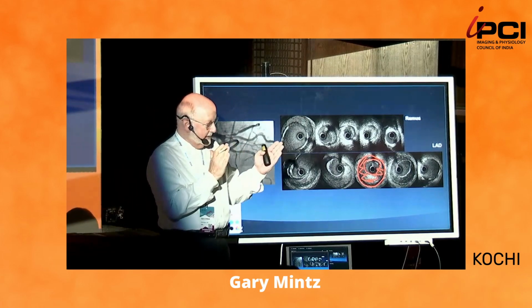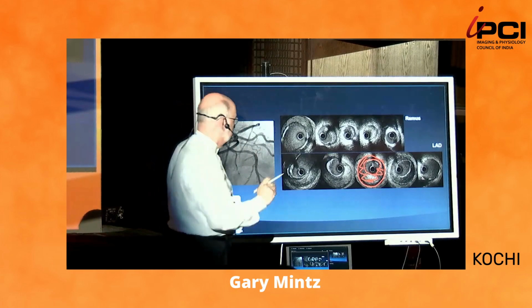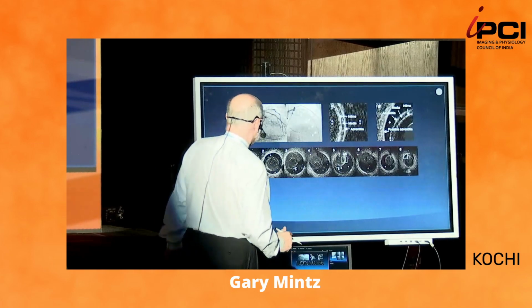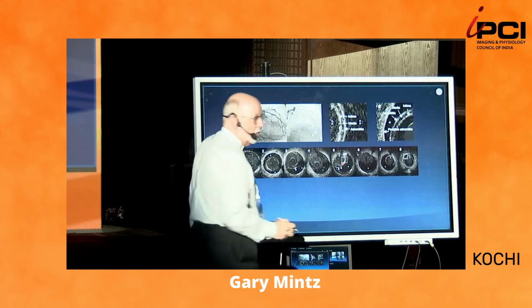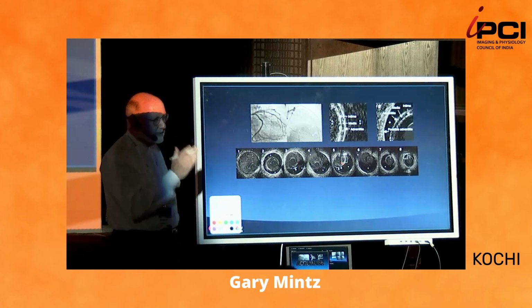Now, I used to think that a spontaneous coronary dissection was that the media broke in half and the internal elastic lamina contracted and the external elastic lamina expanded. Not so. This is an HD IVUS image, and notice intima, media, and adventitia all collapsing. So this is actually a separation in the external elastic lamina.